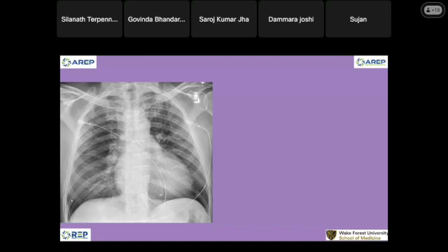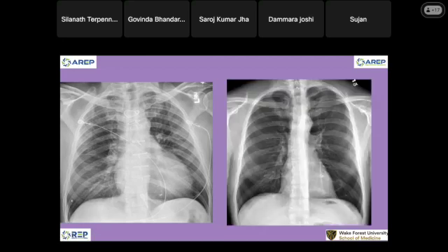So let's say, easy one here, cardiomegaly. What else? Okay, look at this. Look at my median sternotomy. Look at my sternal wires. See that? All line up nicely. The patient has had surgery. And look at this. These little clips here, see that? Little clips here right at the bottom of the heart. We can tell that the patient has had bypass graft surgery, using the internal mammary graft as a bypass graft. Okay, that means this patient has ischemic heart disease, a very bad one, already got bypassed. Okay, what else? Everything else looks normal besides the big heart, compared to a normal one.